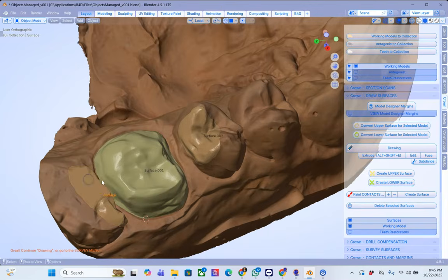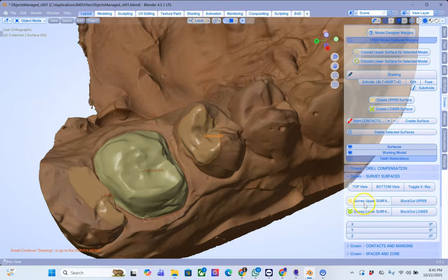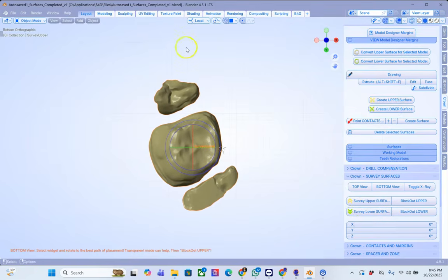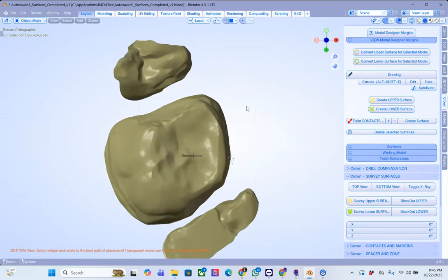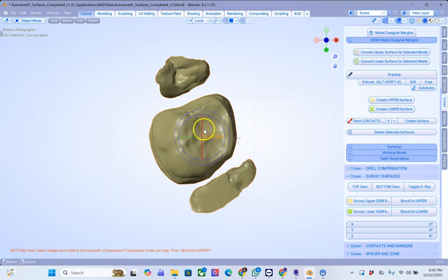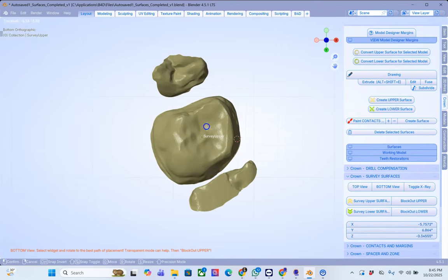Following that, select Shift left click, and go to the survey. Now once you click that, everything else disappears, and this scene is locked. You can only pan it. You cannot rotate it. I'm trying. You can zoom it. In the past, some users got confused and started rotating the scene and not the object, so we've decided to lock it.